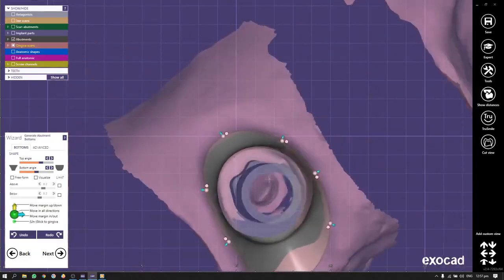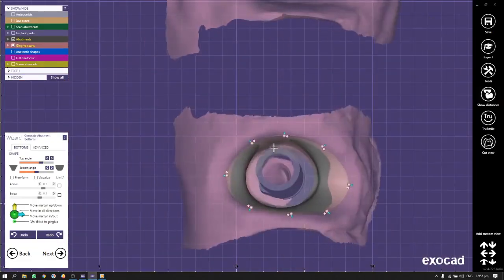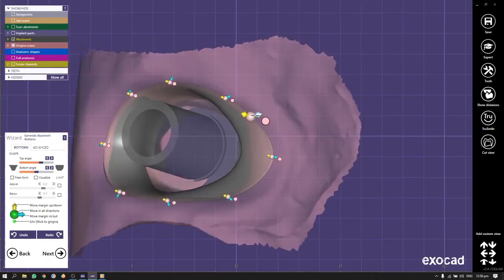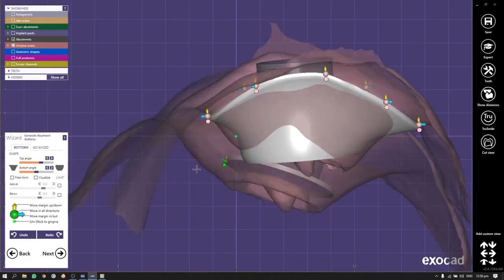With Ctrl and left mouse button, we can create new dots. If I put the cursor and press left and then right, we can remove it. Ctrl left mouse button, it appears. Left and right mouse button, it will be disappearing. That's about the finish line.